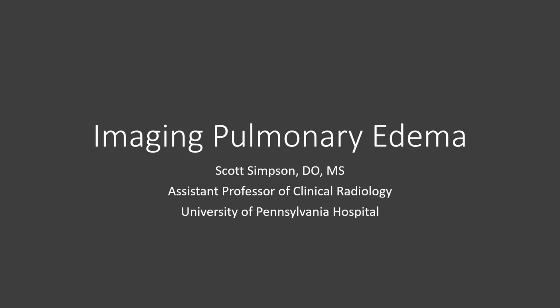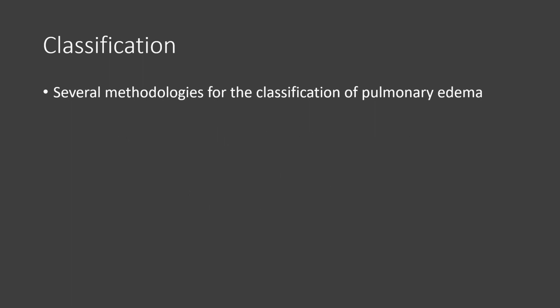Okay, so today we're going to be talking about pulmonary edema on chest x-ray with some CT correlation. Before we jump into the chest x-ray manifestations, let's first talk about how to think about pulmonary edema. There are several different ways of doing this. You can either think about pulmonary edema as it relates to its pathophysiology or to specific causes.